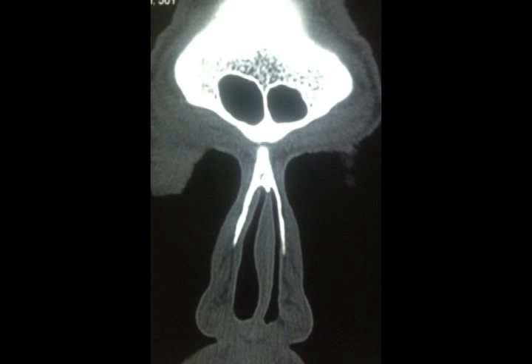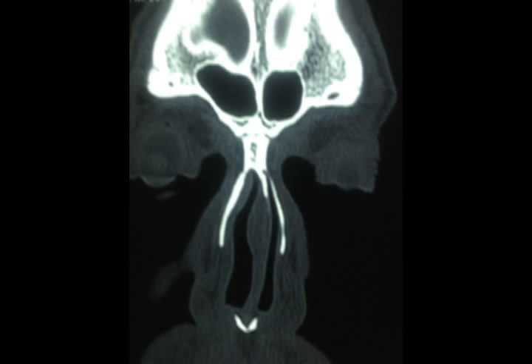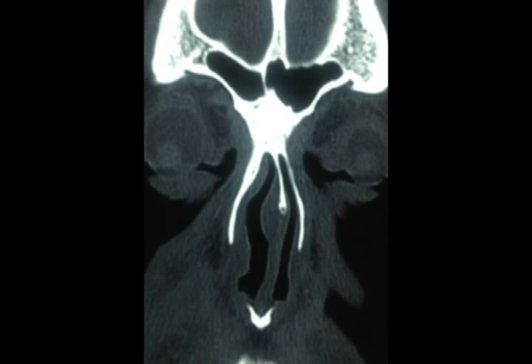frontal sinus on both sides, the ascending process of the maxilla, the cartilaginous portion of the nasal septum deviated to the left side. You can see the septal body is very prominent on the right side, and you can see the frontal sinuses and the nasal bone, the frontonasal suture there. This cut shows the frontal sinus very clearly, the superior deviation of the nasal septum to the left side, and the septal body prominent on the right side.